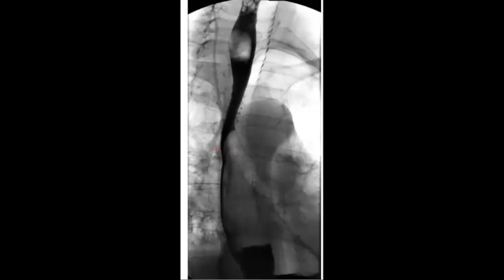So after all this, you can go to the diagnosis. I see that both Nermin and Alaa are going with esophageal intramural pseudo-diverticulosis. Okay, pseudo-diverticulosis. There is a stricture in the mid-esophagus. There is aspiration.